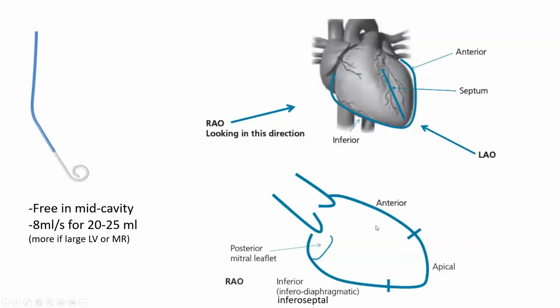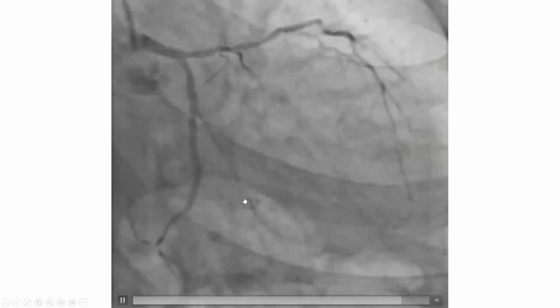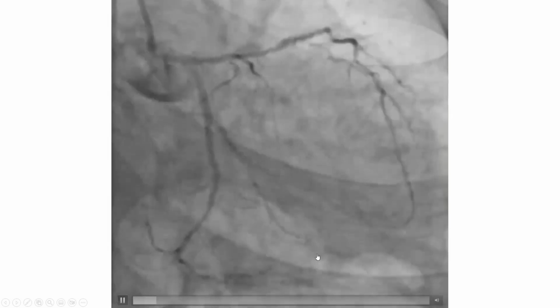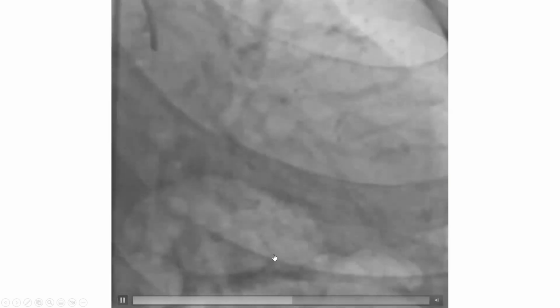And here I will show you. Even though you don't see the lateral wall, when it's akinetic and bulging, you can see its projection. But it will be in this area, in the middle. And this is what this patient had. He had an OM occlusion. That's what caused that akinesis. This is an inferior OM territory, so you get that bulge in the mid-inferior wall.